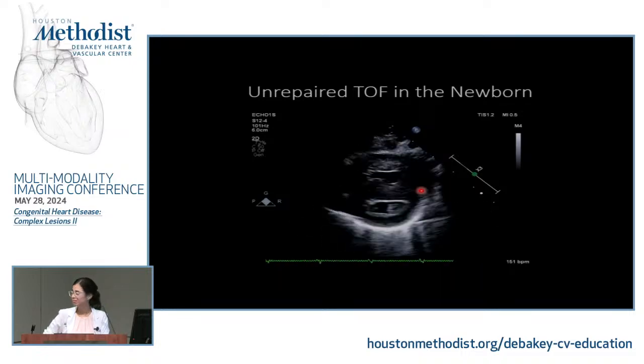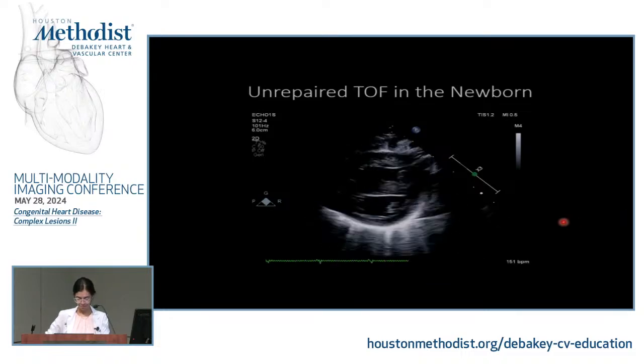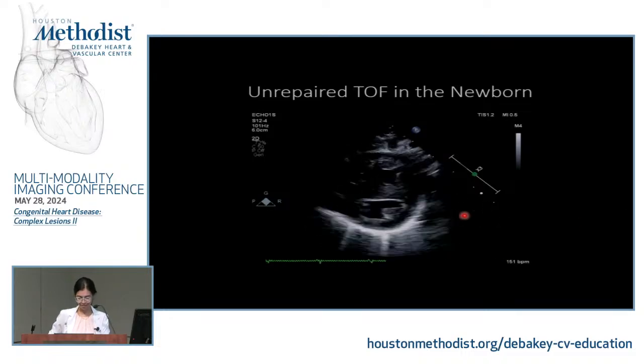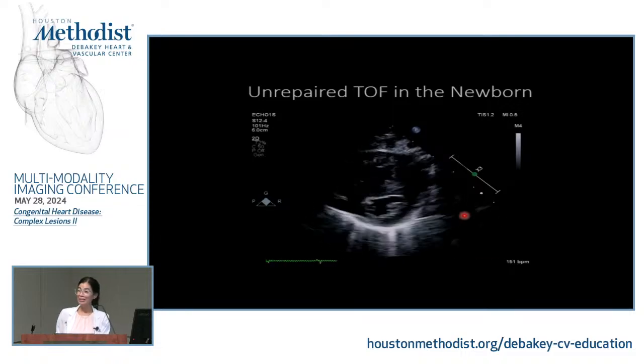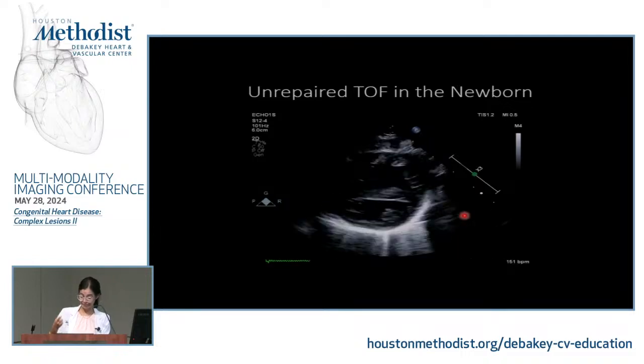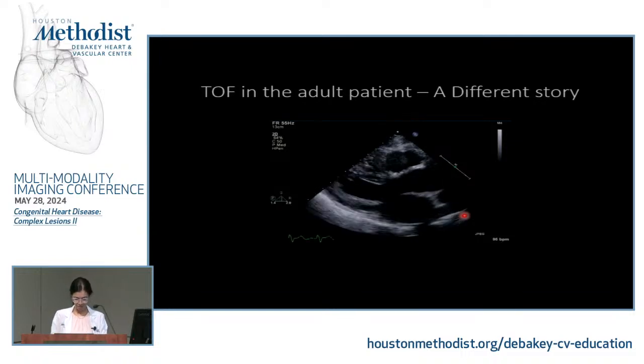Okay, and then here, any observations about this one? RVH, right? Yes, and septal flattening. Yes. This is something that I will never say you will never see, because you have. But in pediatrics, that's how it's diagnosed at birth.